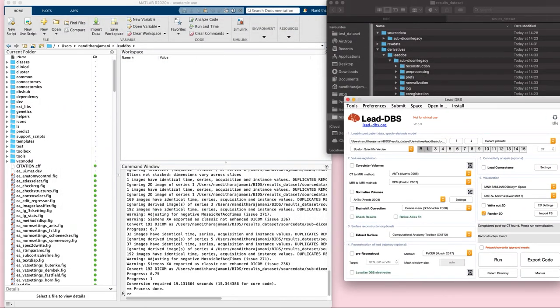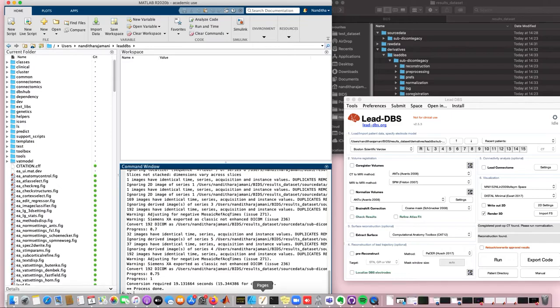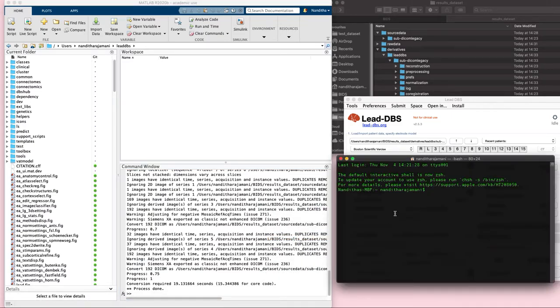So maybe now we can actually go into the practical steps of running Lead-DBS, the BIDS version of Lead-DBS. So let's assume that you are now in the develop branch of Lead-DBS. The BIDS version of Lead-DBS is hosted in the BIDS branch. In order to access the BIDS branch, you can use your Git manager or terminal. I will be using a terminal here, and you can go into git checkout BIDS.